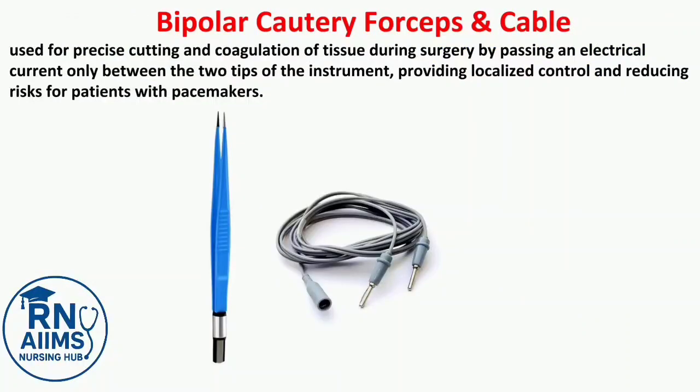Bipolar cautery forceps and cable. Used for precise cutting and coagulation of tissue during surgery by passing an electrical current only between the two tips of the instrument, providing localized control and reducing risks for patients with pacemakers.